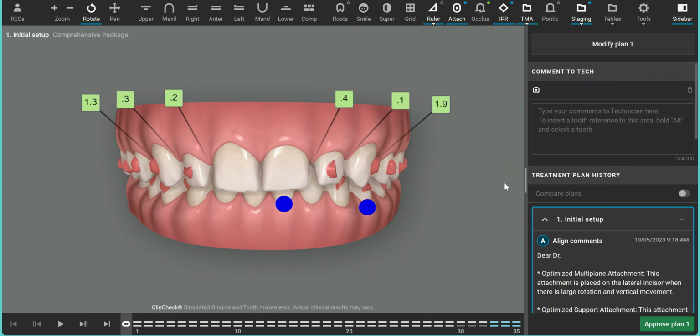I'm founder of InvisalignDoctors.com. Have you ever had an Invisalign case that finished with premature anterior contacts and you're not sure why? Is it possible that there were unnecessary posterior tooth movements in the treatment plan that you were unaware of? Movements that caused the premature occlusal contacts. Let's look at a case here.